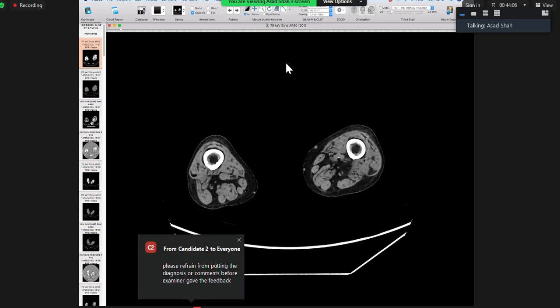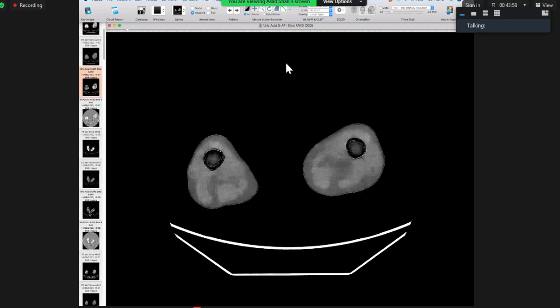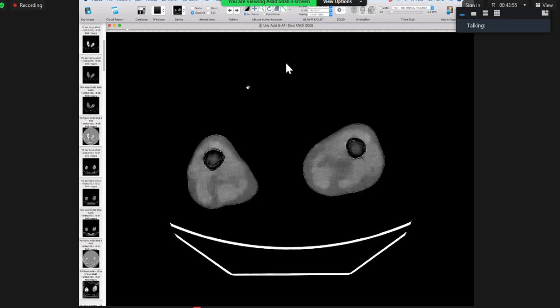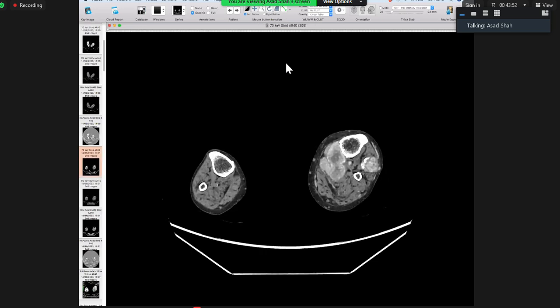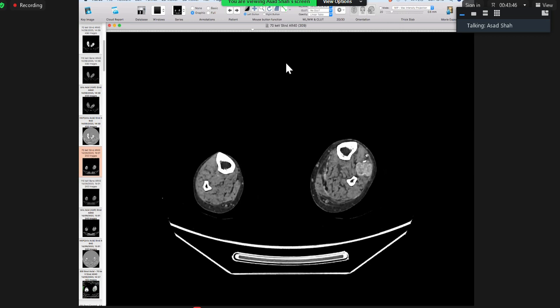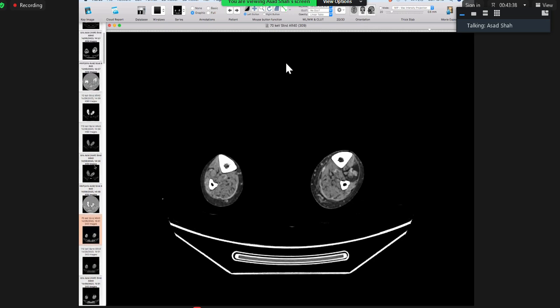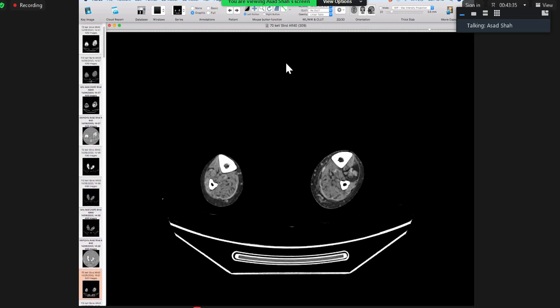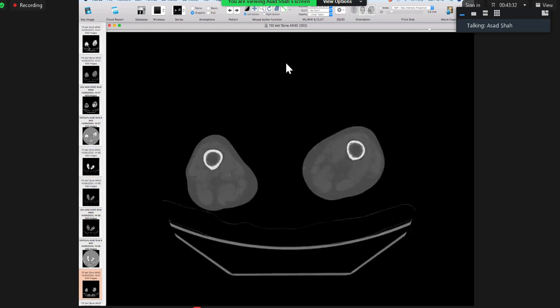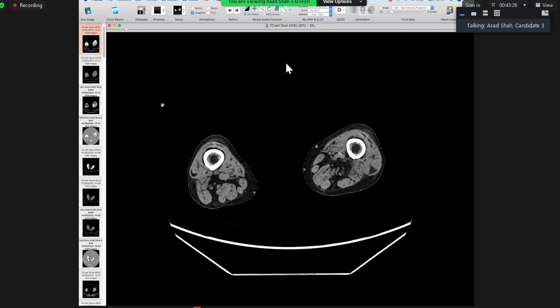I'm gonna jump actually. Wait. What about this one? No. Wait. I think I've got it. This one might be. So that's the distal leg. Okay, let's go into the distal leg though. We need the proximal leg. So if this is still 40, and then probably if I go on this one. Yeah, that might be this one. Yes, just a second. I've clicked on that. Let me scroll it for you.